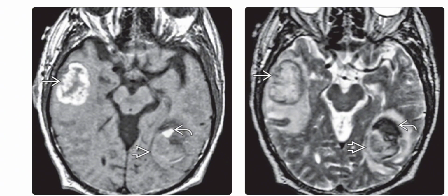Right image is the axial T2 weighted MRI, and it shows the heterogeneous bright signal in the hyperacute portion and the low signal in the acute slash early subacute portion of the posterior hemorrhage. The late subacute hemorrhage has bright T1 and T2 signal intensity.